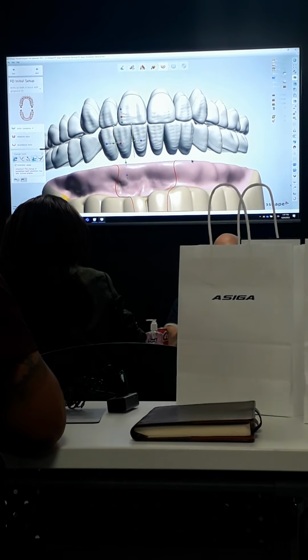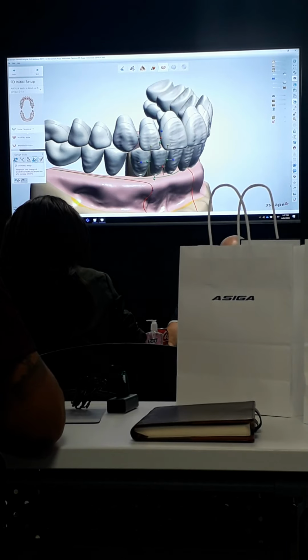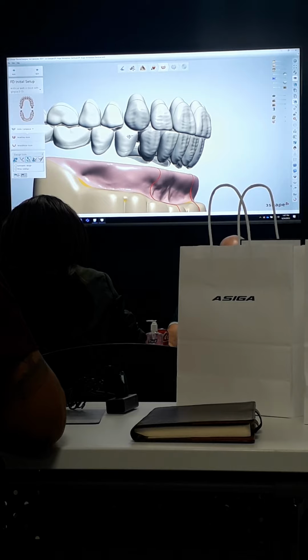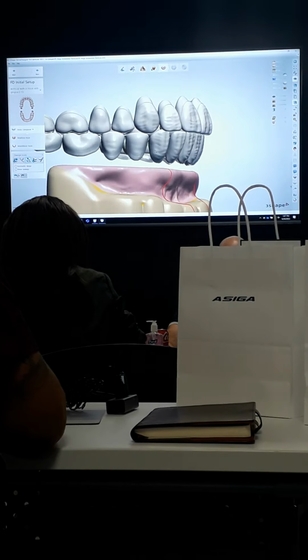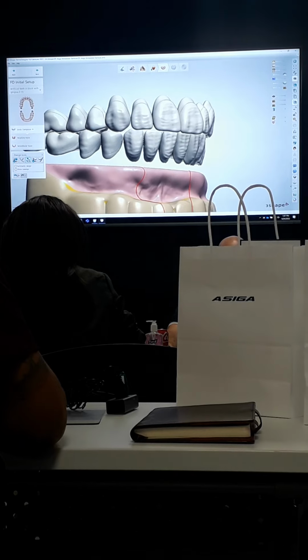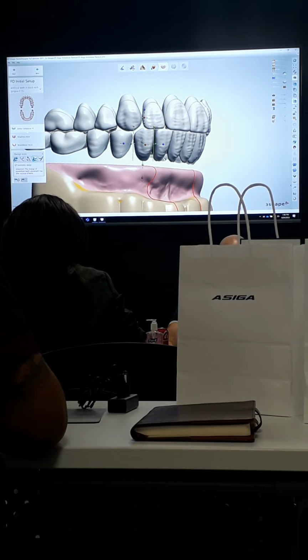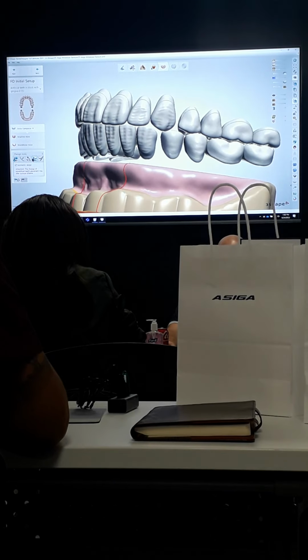So let's say I was happy with my anterior setup now, but I know I have this massive gap here from my posterior. So rather than trying to slide each individual tooth forward in the posterior, I'm going to go back a tool, grab this, and just pull it. If I end up contacting here and getting a space here, I'll just come in here and make sure my symmetric design is turned on, and I'll just pull this canine back. So then I'll go over here and do the same thing.